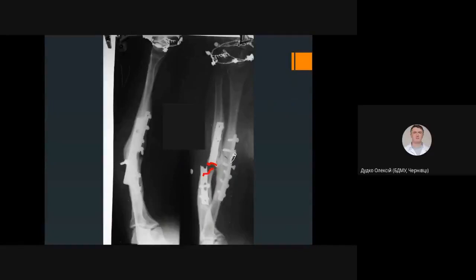Another thing that we can note is a hairline fracture of the radius bone. Perhaps it was nicely reduced. So also we can see that there are some metal devices, a plate and screws, that were used for fixation. If you note, the plate on the ulnar bone was broken due to additional injuries that happened.